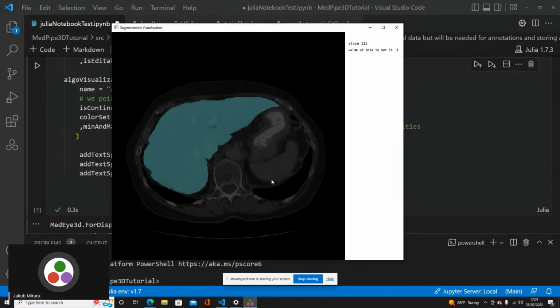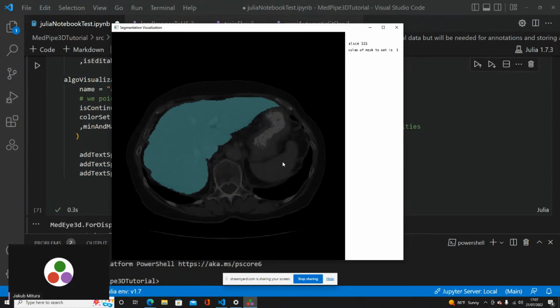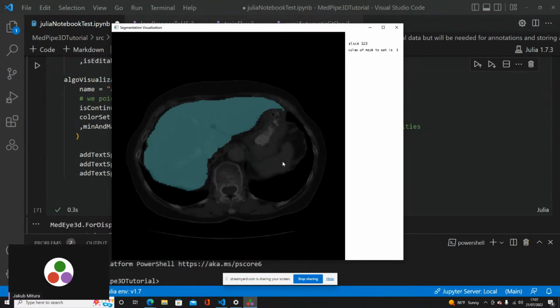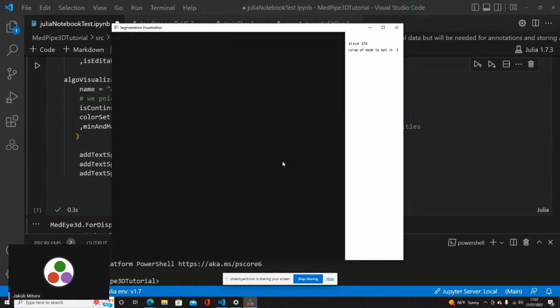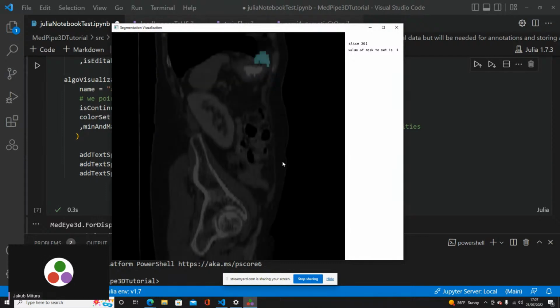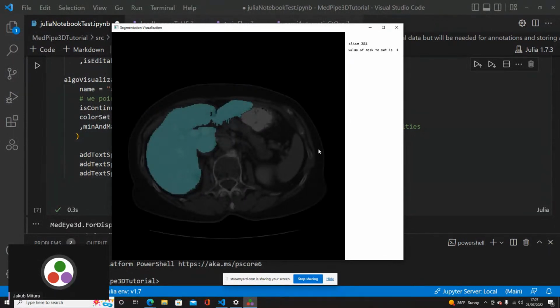Now, what is also important: when you press F, it's scrolling fast, as you see now. When you press S, it's scrolling slowly. So one more time: F for fast scrolling, and space 1, space 2, space 3. The commands execute when you release the keys, so you hold space 1, 2, or 3, and when you release, this should be visible.